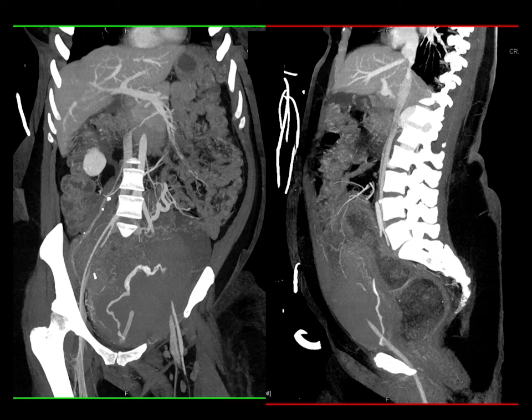Also, it's important to give patients oral contrast. We typically use water in kidney-only studies and hematuria studies, but then you get contrast excreted into the bladder that can be helpful. But all of the ways of looking at the bladder become indeed very critical.